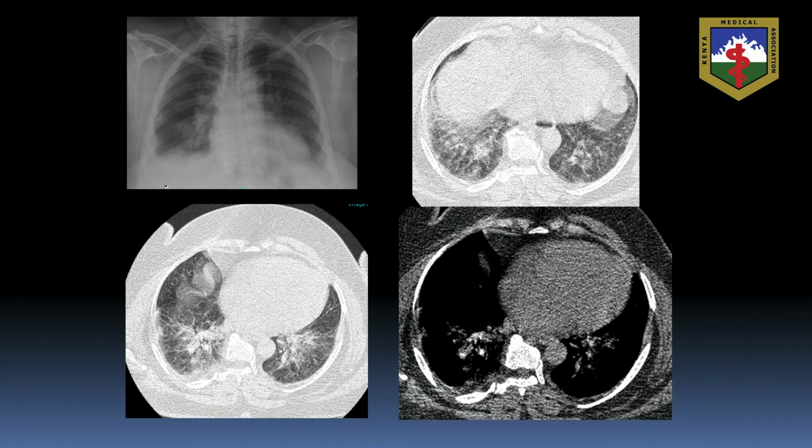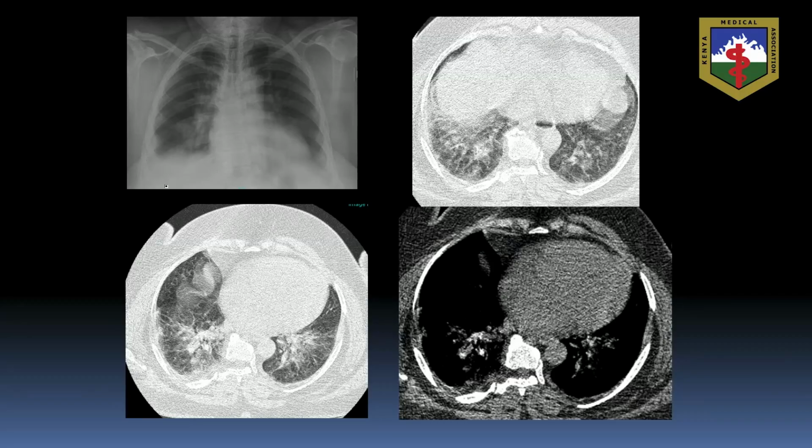You're getting intralobular and interlobular septal thickening, which gives you the crazy paving. Again, if you look, you're beginning to get subpleural consolidation. These were the lower lobes of the lungs. The other thing you can note is that there were motion artifacts. Remember, these patients are not able to breathe well. They have difficulty in breathing, and they also cough during the procedure.